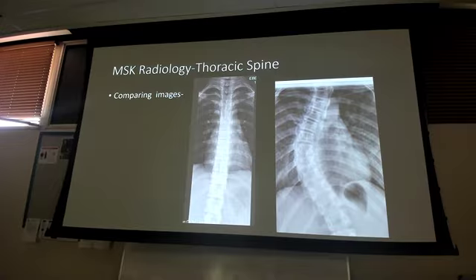This is something we can diagnose with the thoracic spine X-ray. What is that? Scoliosis. What are we going to do for that? Refer. You're ready for family practice. Don't refer. What's that? Does anybody know?